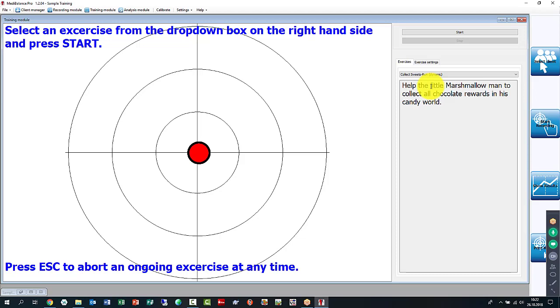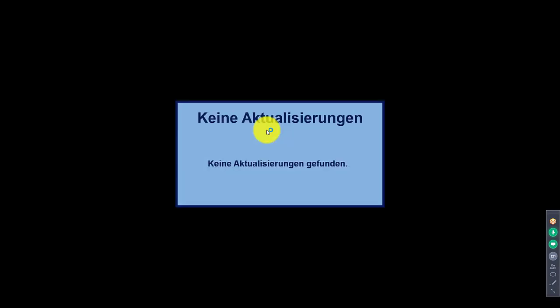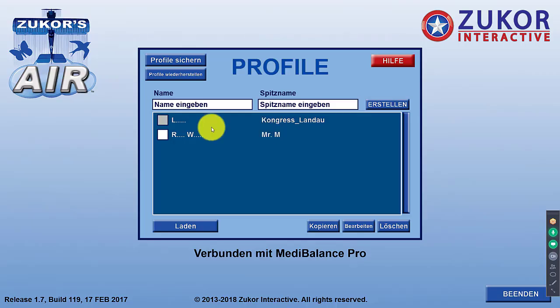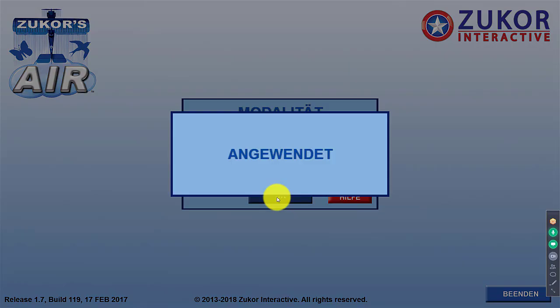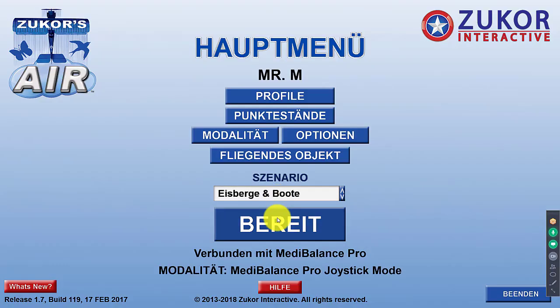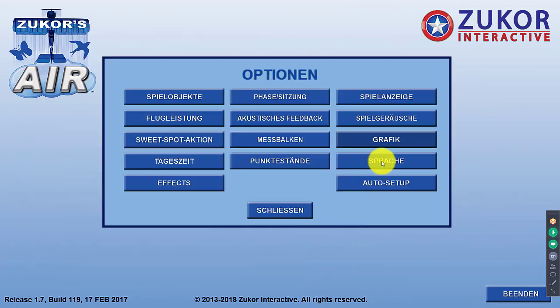We'll terminate the game and take a look at the last 3D game we have to offer. It's a very cool functionality, but it's a third-party game that we sell as an option for the product. Okay, let me just briefly show you how it works. This is actually the toughest form of training that we have, and of course it's available in English as well.